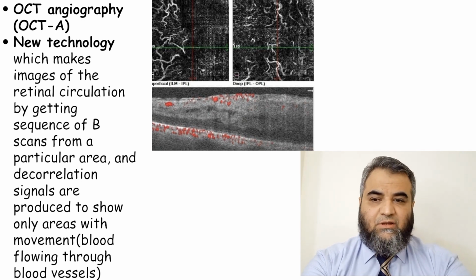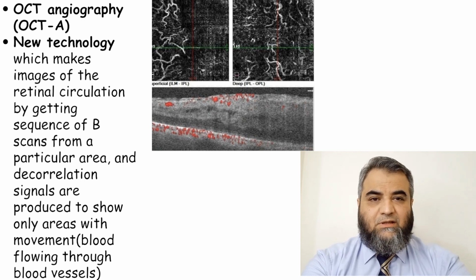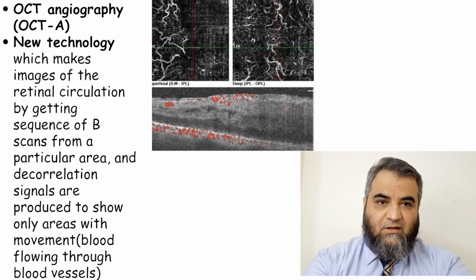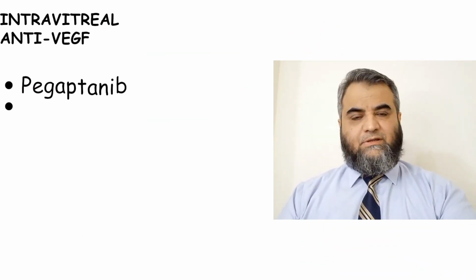It shows us the presence of choroidal neovascularization, which is shown here in the red dots. It has an edge as compared to the OCT, because before the development, it can show us the presence of choroidal neovascularization. Nowadays it is very helpful for the diagnosis, the management and further evaluation.